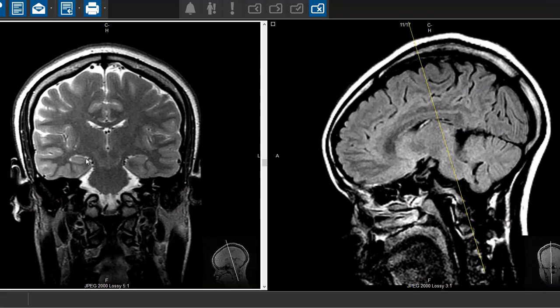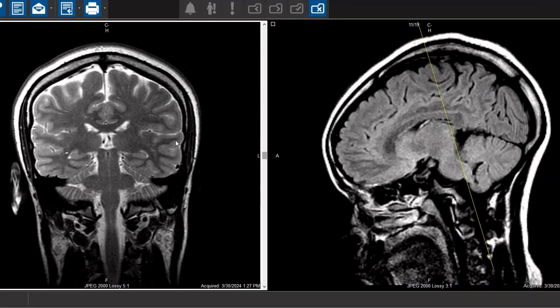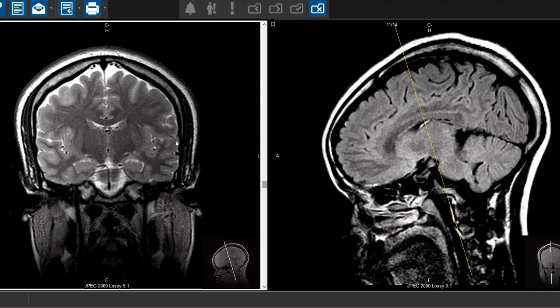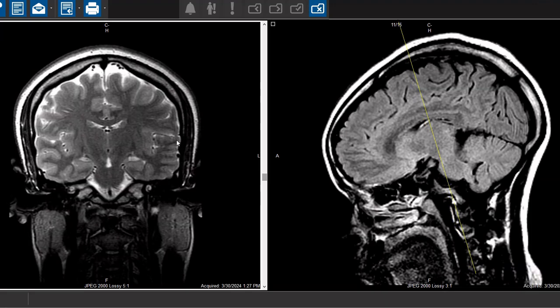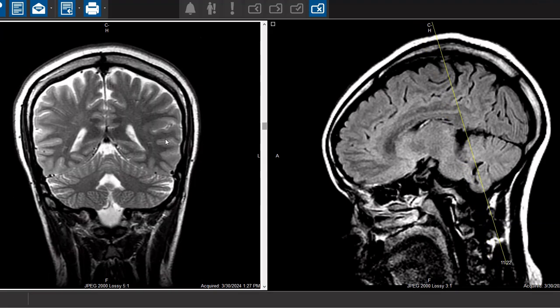shrink and become atrophic. And when it does, a little potential space can fill up with fluid above it. So we look for asymmetry, abnormal signal, and is there a little fluid collection on one side that would indicate atrophy. And in this patient, things look nice and normal, so no evidence of mesial temporal sclerosis. We look for an infarction or hemorrhage, we don't see that. And we look for brain tumors.